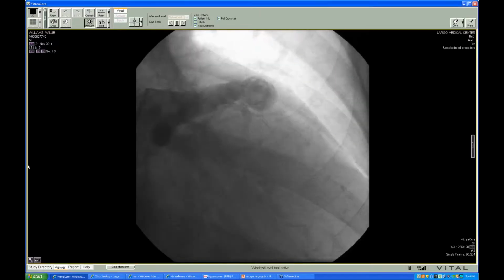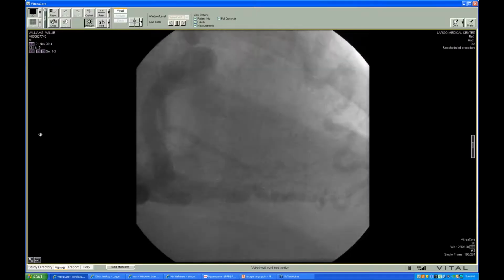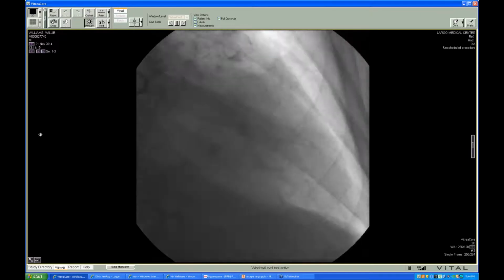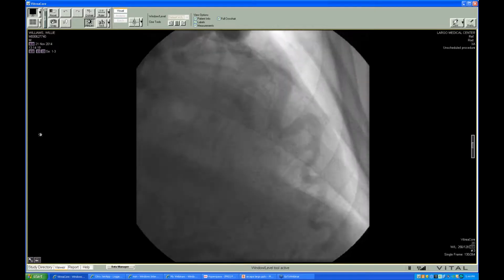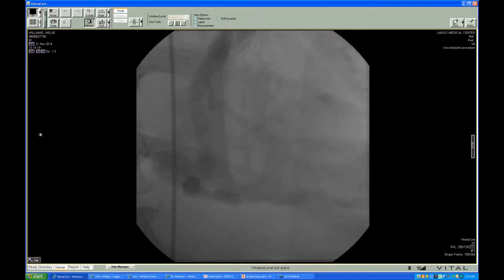So is it a fistula going into the pulmonary artery or some other place? Because I can't tell that from here. It almost looks more like this huge ectasia of the left main LAD, and then almost like a pseudoaneurysm. That's all fusiform? Yes, it is.